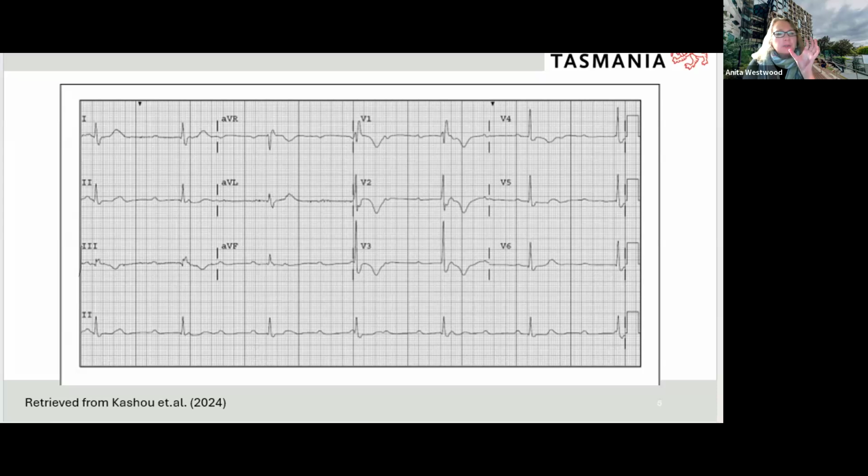In there, you've got the atria that are in the atrial part of the heart. You've got a complex that's occurring, a P wave, and in the ventricular part of the heart, you've got complexes that are occurring. But what's happened here is that you've got no conduction between the atria and the ventricles. Georgie, if you want to explain this, but you've still got atrial complexes on there because you can clearly see upright rounded P waves.